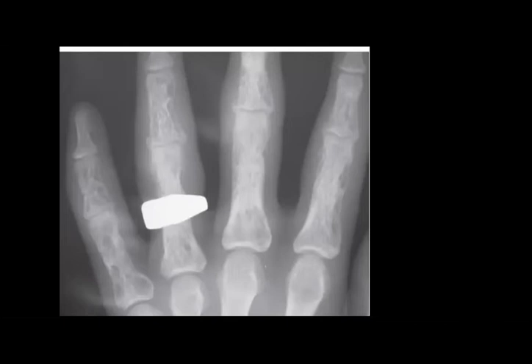And just good to mention, take care about the articular joint, that it is preserved. So when you comment about the articular joint, you will not find any erosive changes, right? Then you can differentiate it from other erosive arthritis.